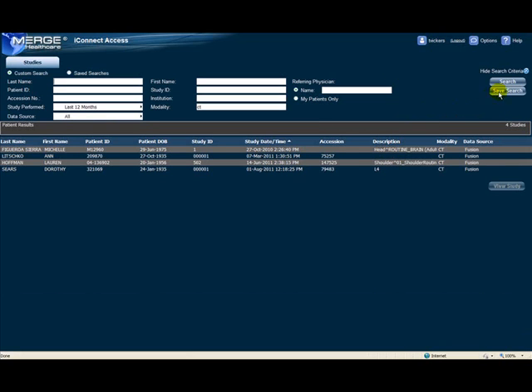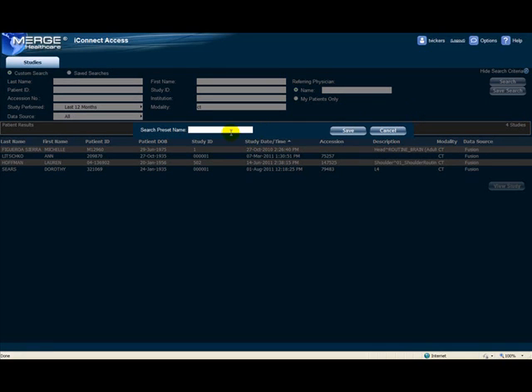Now I can save this search and name it what I like. I'll call it CT's one year and save.